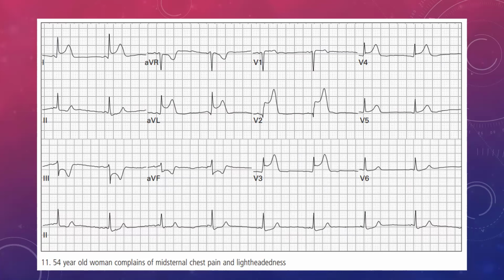Just looking at them, knowing what we have, especially if you look at the amount of ST elevation, or the height of the ST elevations, without working out any formulas, do you think this is mild, moderate, or severe?